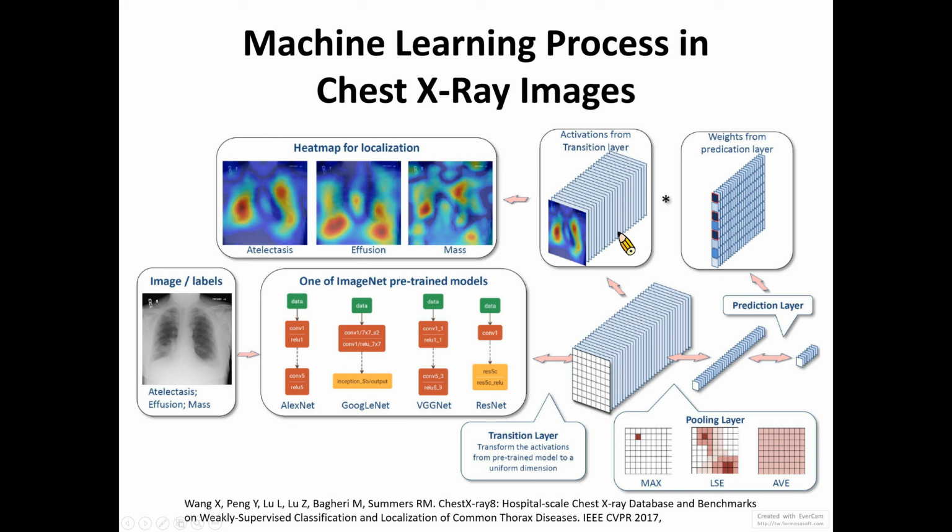These images come from a large collection of patients that have different kinds of chest and lung disease. So you will see that the images include children's X-rays, adults', and older people's.